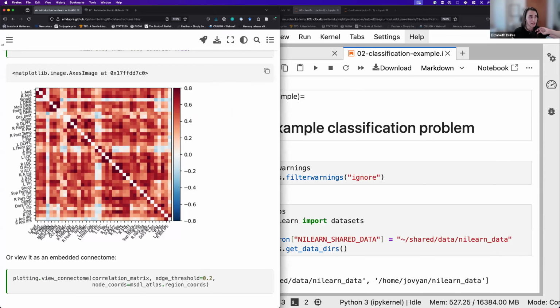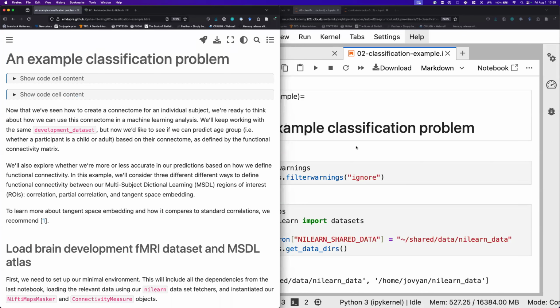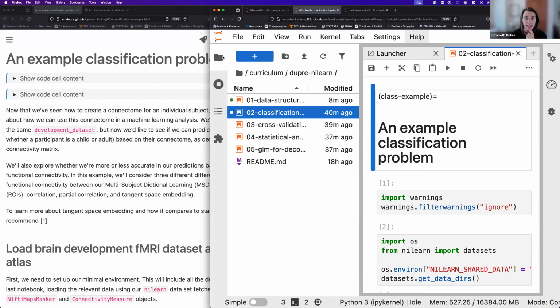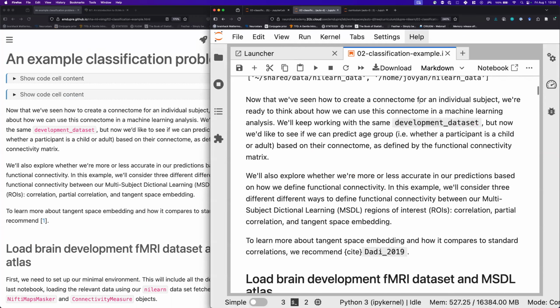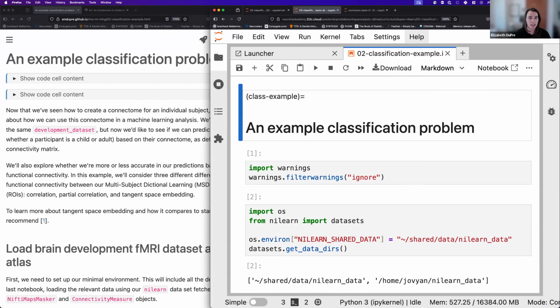No? Okay. I'm curious. Oh, yeah. Sorry, you specified like the option, I think, and you made it a correlation within the code. Yes. And I was wondering if there's like a command that we can use to see what options exist. Yes. Okay. So the question was, is there a command you can use to see what options exist?